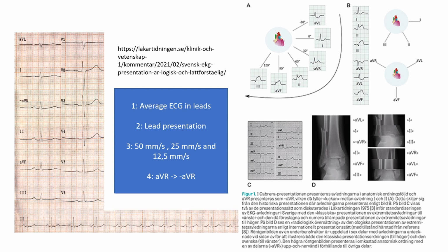The first one is that all of these leads here are average, meaning that you don't get what you call the rhythm strip down here. You get an average ECG, PQRS-T, made up of maybe 10 or 20, I don't know how many, QRSs, right?